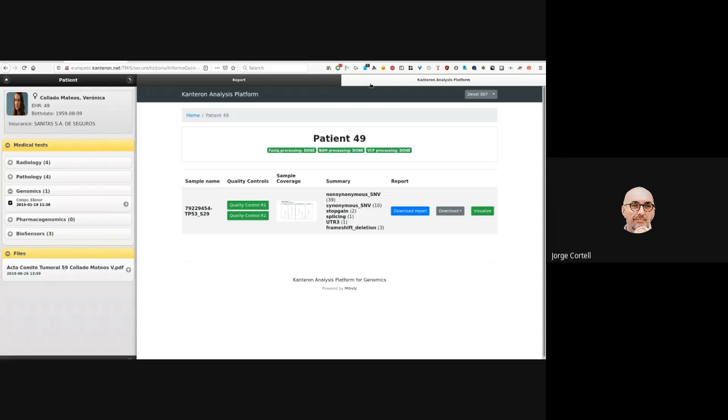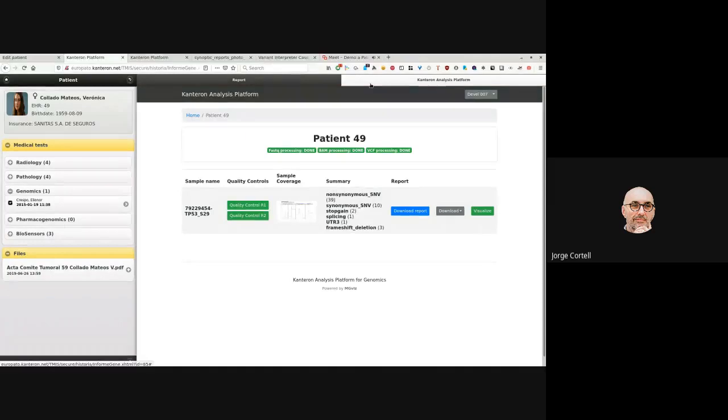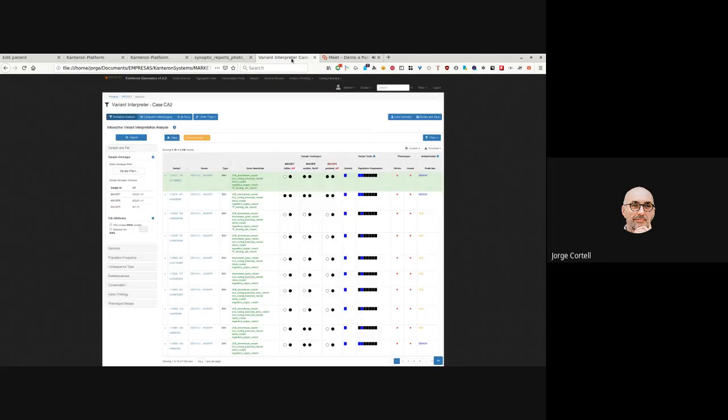One is the complete one, if you will. One is for geneticists. One is the specialist that needs to fine-grain looking at many details. This is a screenshot. I'm not going to do the demo right now for you because, again, that takes a bioinformatician, which I'm not, and also a lot of time. And so to keep it short, I'm going to show you what it looks like.